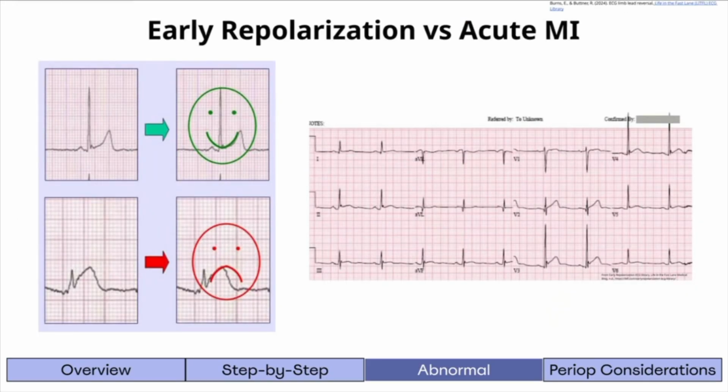One important ECG characteristic that often mimics an acute myocardial infarction is called early repolarization. It is a normal variant that is often seen in young athletes. It is synonymous with the J-point elevation, or elevation of the point where the QRS usually meets the isoelectric line. Elevation in this case should be concave and greatest in the precordial leads.